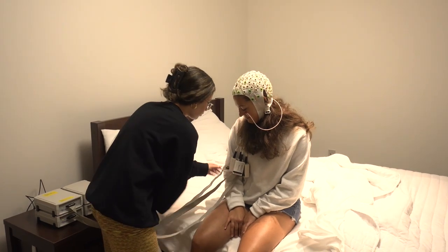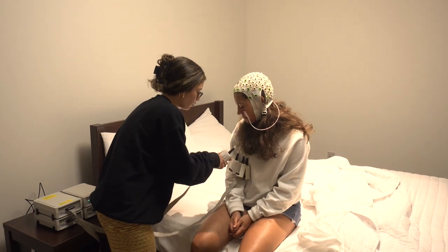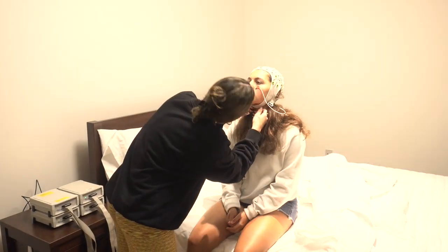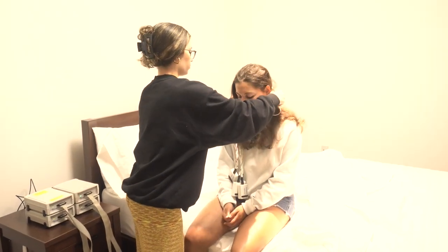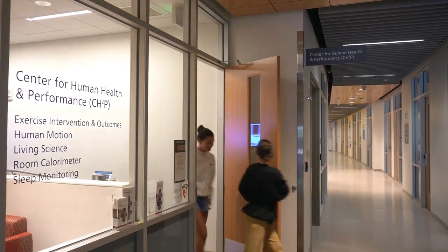Though EEG is the gold standard for sleep measurement because of its accuracy, it is a cumbersome, expensive, and often uncomfortable process. Alternatives, like actigraphy, or new wearable sleep monitoring technologies like Fitbits, can often monitor sleep with less disturbance and for less money. However, they are also less accurate.